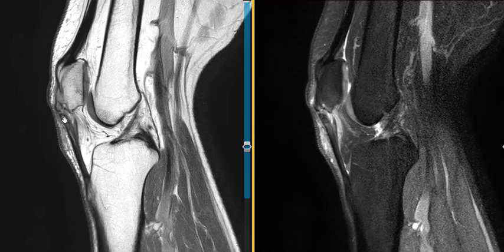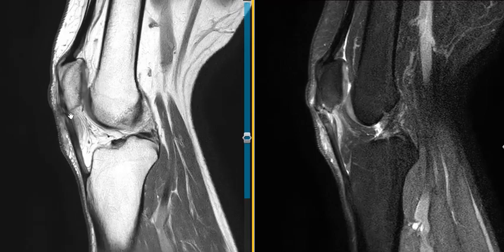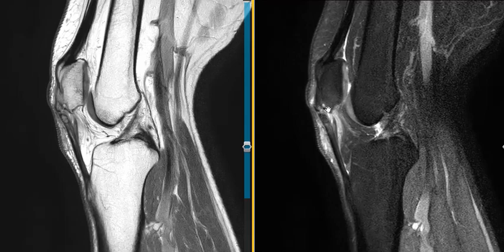We see it looks almost like a puzzle piece, a piece here that should fit right here. So this is chronic irritation, probably during development, way back when he was 11 years old and started having the symptoms, and he just never let it heal and incorporate. So this is a little fragment that's hanging off the bottom, and he has micro tearing and inflammation there centrally, and this rind of edema around it.